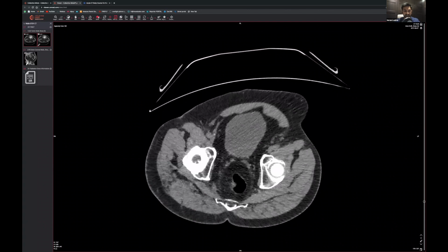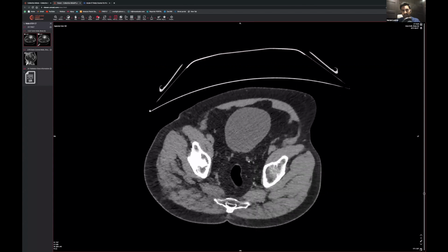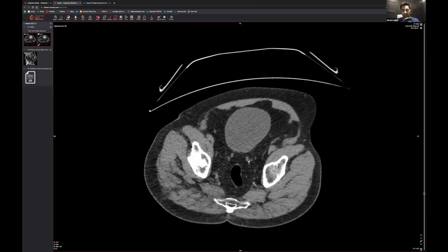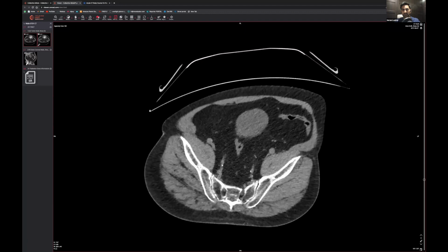So this side, let's have a look. It's actually sometimes better to go from the vesico-ureteric junction rather than the other way. But you can see it turning up this way, and you come up here and you think, oh, is that a stone? That one there. But actually, look, that's a ureter, and that goes down that way. So that can't be a stone. That must be a phlebolith. So that's one way to figure out whether it's a phlebolith or not. Just see whether it falls in line with the ureter.